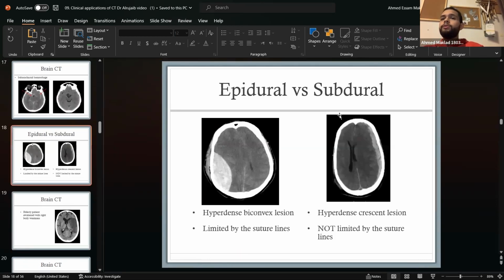All right. So this is an epidural and a subdural. One of the ways I remember is that the one that looks like an eye, when you look at someone's eye from the side, it looks like this, right? Because it's bulging. That's how I know this is epidural.